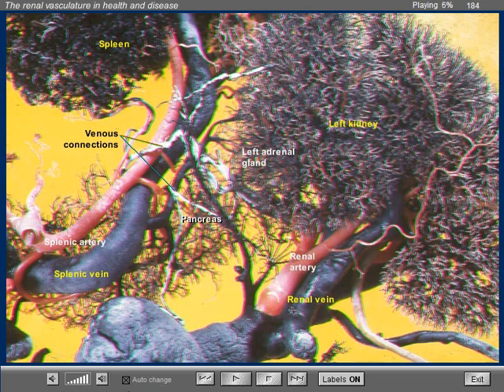This is a close-up of the tail of the pancreas. I stained in white the intravenous connections between the upper pole of the left kidney, the left adrenal gland, and the pancreatic veins. Large venous structures are seen between these organs.